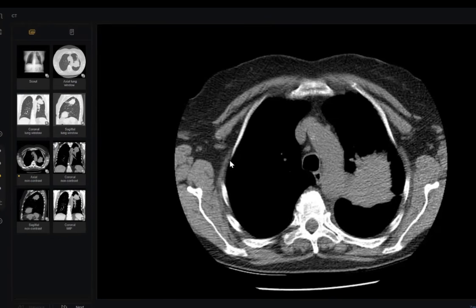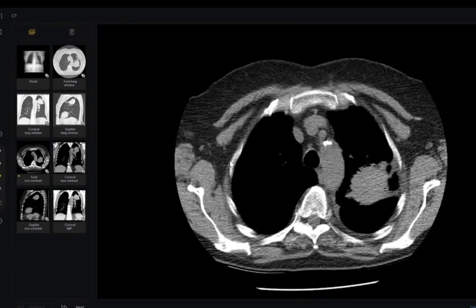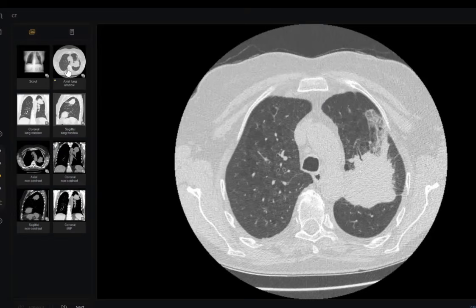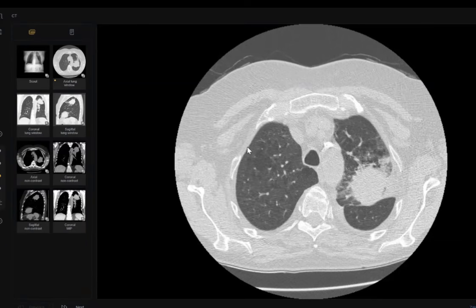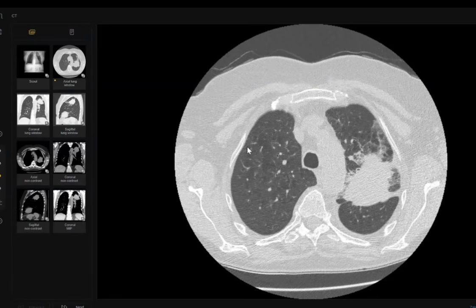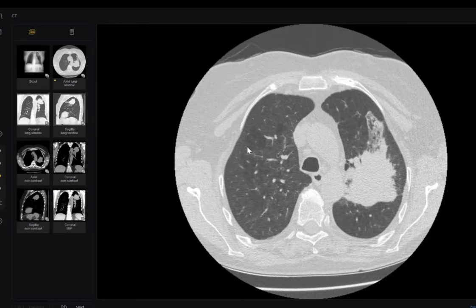Okay, doctor. If I ask you, by the way, there are some things that need recorrection. I will recorrect during my comment. But if I ask you, how could you do a biopsy from this patient? I will give you this lung window. How could you? The word how means the procedure, the direction, everything. The proper selection of slice, and whether it is prone, anterior, posterior, lateral. This is what is meant by how.